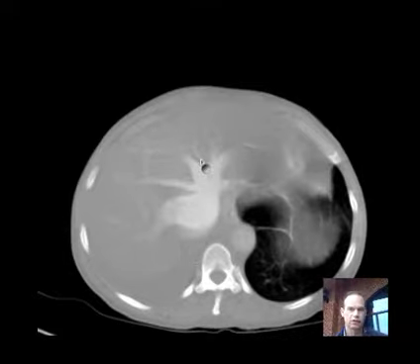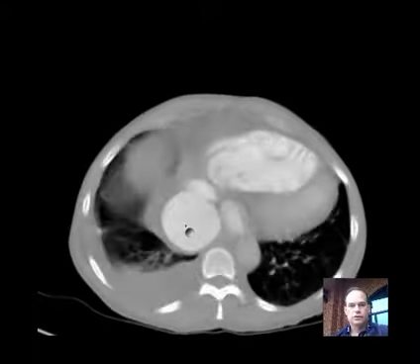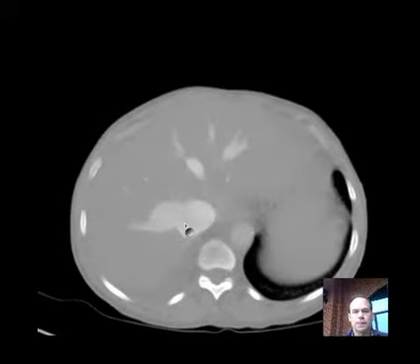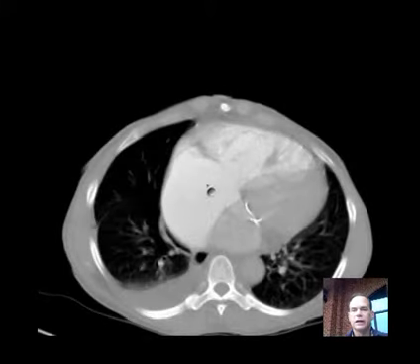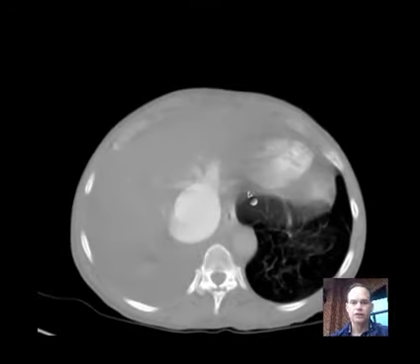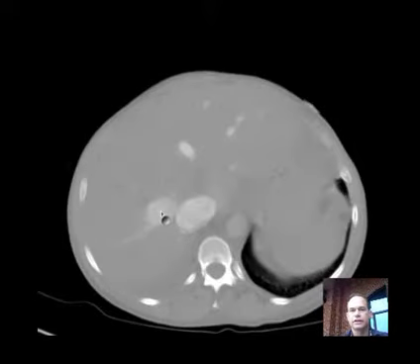This is actually what they call in ultrasound the Playboy bunny sign, and it just looks kind of more like a Playboy pig because it's got this big snout because of the dilated vessels. Okay, so this is an inferior vena cava coming into the right atrium. It's all dilated. So, cutting to the chase, you have a right atrium and right ventricle which are disproportionately enlarged compared with the left side of the heart. You have an inferior vena cava, which is very dilated, and you have distended prominent hepatic veins.